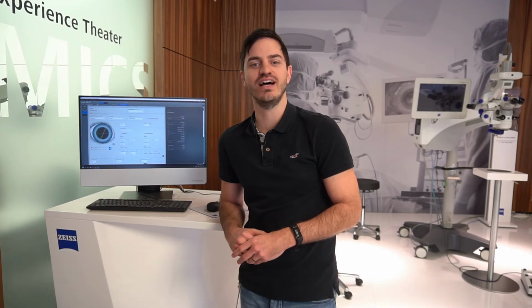These videos are designed to educate you on how to use the workplace. In this video, we will show you how to open ZEISS EQ Workplace.